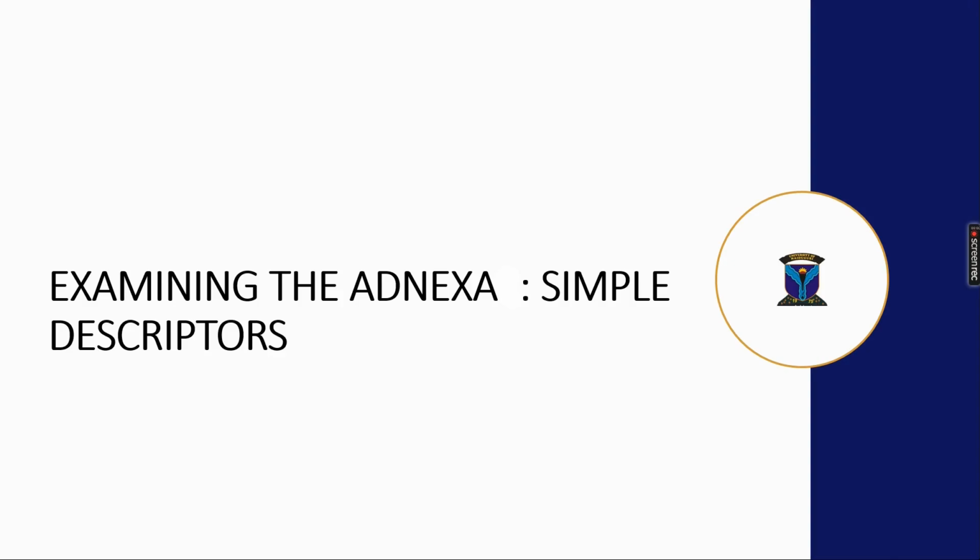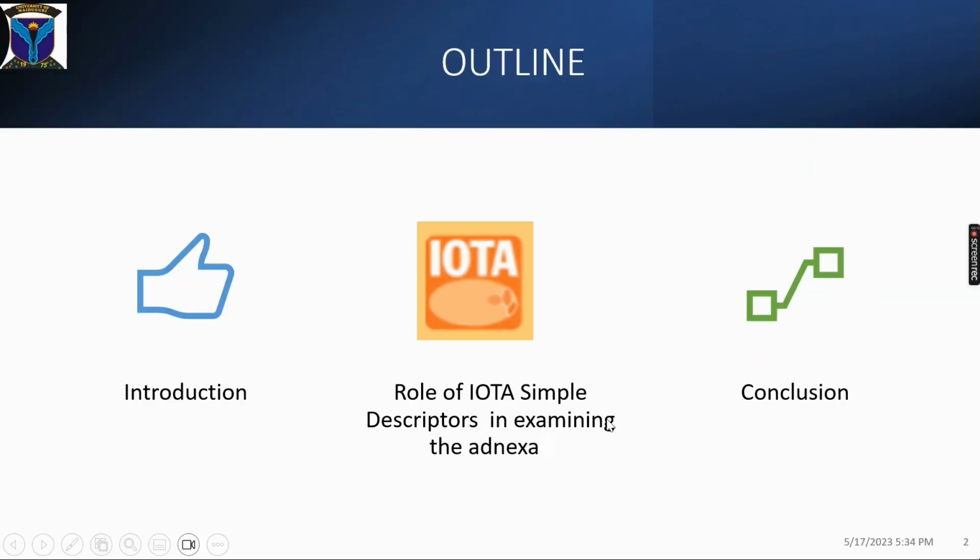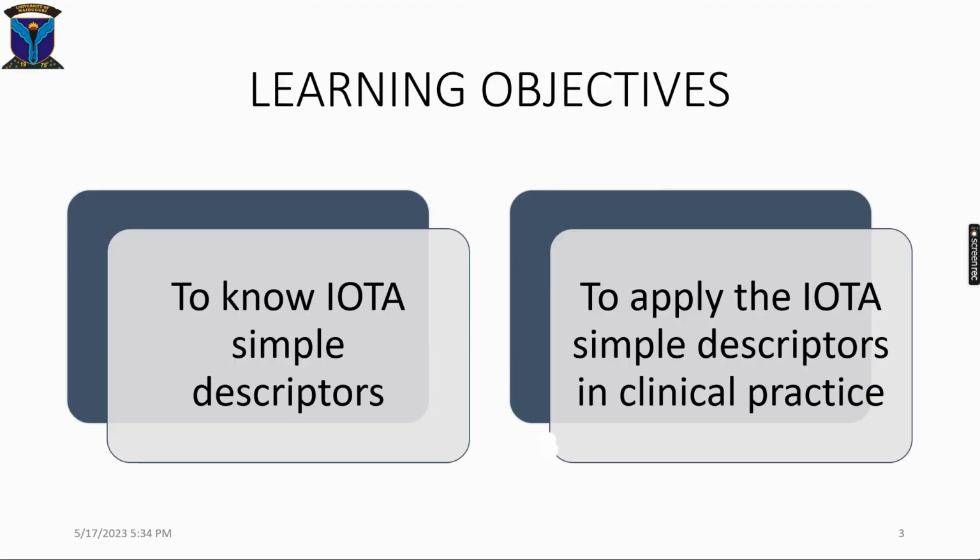Examining the adnexa using simple descriptors. We look at the role of IOTA simple descriptors in examining the adnexa after the introduction and before we run off.